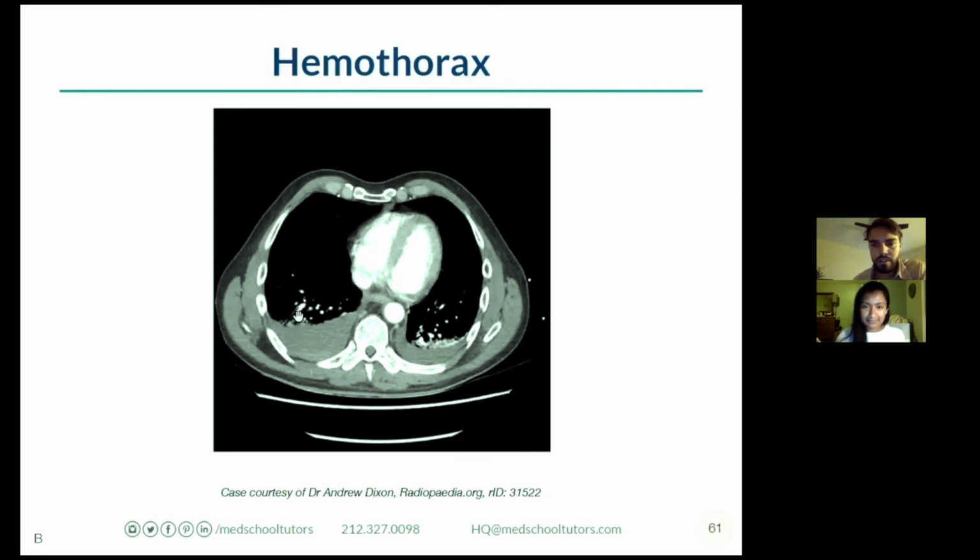So nice. Yeah, so this one's a hemothorax. A lot of different things can cause this. Anything to add here, Sana? Yeah, the reason we say hemothorax specifically, and this is a little bit advanced, is that if you really squint and try with me here, this one area is a little bit denser.